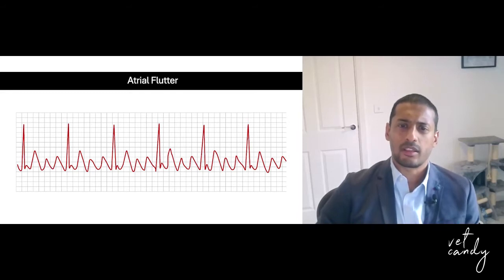In atrial flutter, the atrioventricular conduction is not perfectly regular. There usually is some pattern to it. So in the example shown, there are periods of 3:1 and 4:1 flutter. It's quite difficult to distinguish between atrial flutter and fibrillation on auscultation alone.